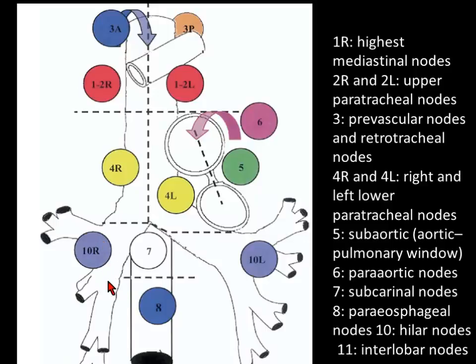And for a node sitting here, which you normally do see, here is the esophagus, and here is the lobe. So it can be an azygo, because the azygous vein is going through from here. So it could be an azygoesophageal node, or more commonly it's called infrahilar, right infrahilar or left infrahilar lymph node. So the clinicians would know that you are talking about the hilum, and infra is below, and the node sitting there is an infrahilar lymph node.